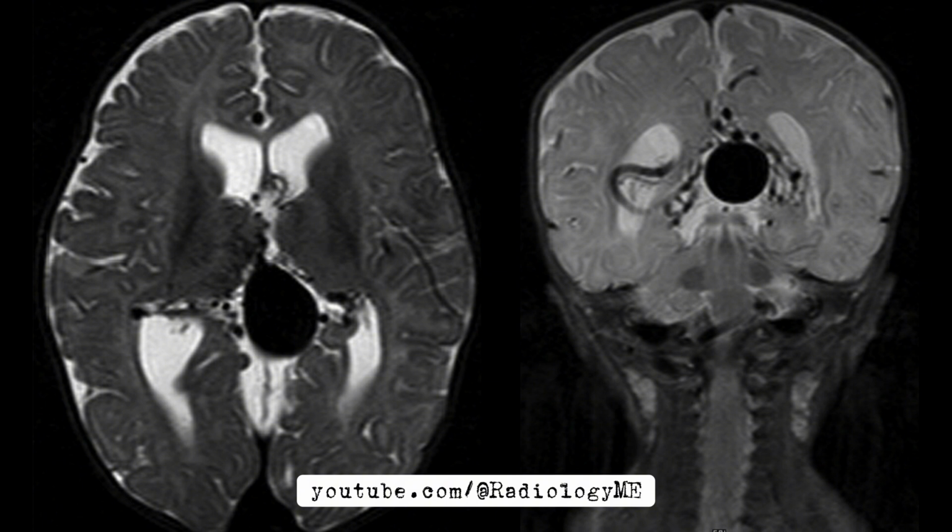Now, when we review the MRI, we can immediately see some concerning findings. First off, on the axial and coronal T2 weighted images, there's a midline posterior mass that's hypointense, indicating a signal void. This signal void usually suggests the presence of a fast-flowing structure, which in this case is a large vascular anomaly. Not only that, but there's also mass effect on the surrounding structures, which isn't surprising given the size and location of this lesion. You can also see enlarged, tortuous vessels encircling the mass. This abnormal vasculature is key in understanding the pathology we're dealing with here.